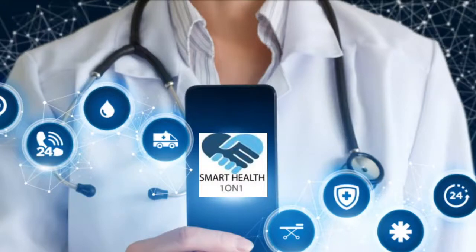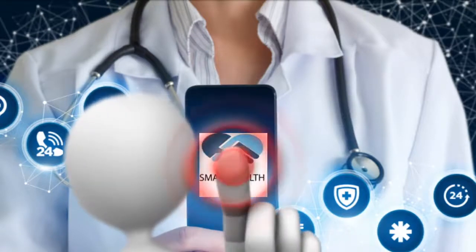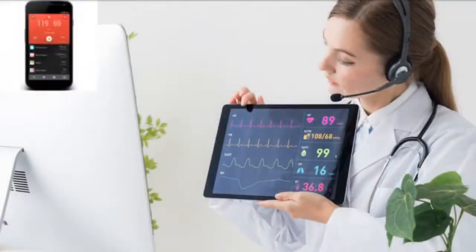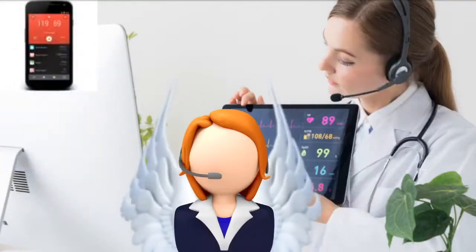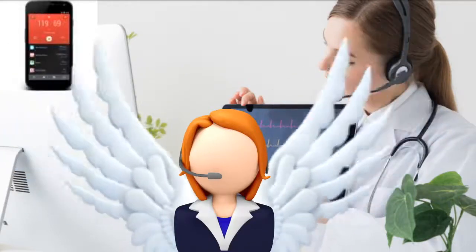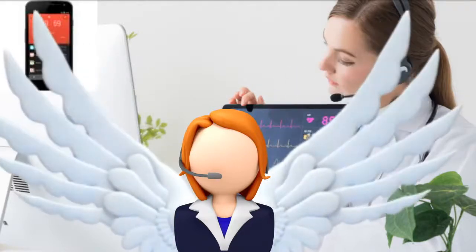Throughout our platform, we include educational tutorials for each screen being viewed, or if the user prefers, they can click on the button Tag Along. This is a powerful customer help solution that SmartHealth offers. Tag Along works on the phone or tablet app as well as the computer and is available to the patient or the client. It is like having a guardian angel who will be watching what you're doing as you do it and can explain how to do it correctly or show you the correct way.